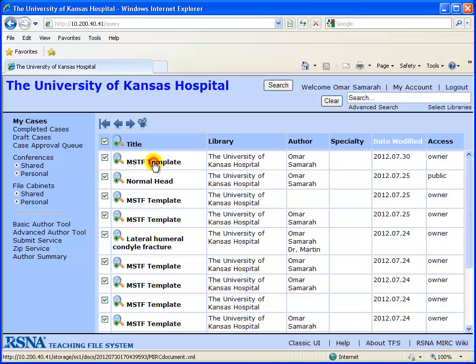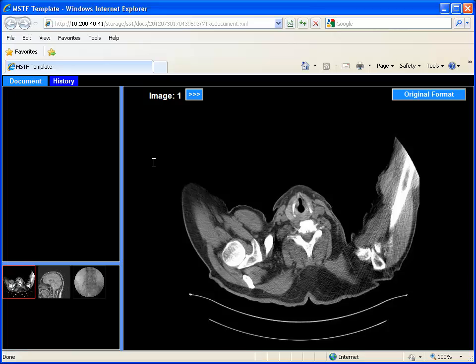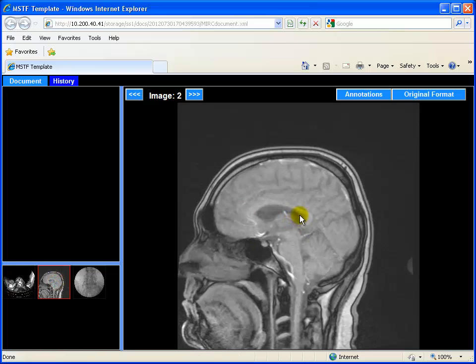The third topic is viewing annotations. So go ahead and just open it in the case browser, like we've opened files before. You can see your image. And then notice that there's an annotations button on the top right. If you click that, it shows the annotations. So when you start, they're not shown, but when you click it, it shows them.